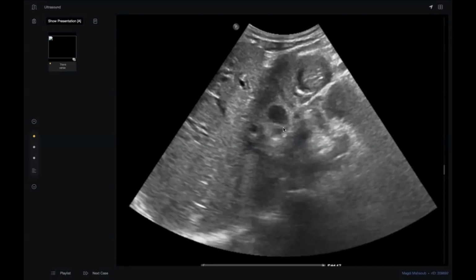I would like to see the pancreas on ultrasound in detail to rule out any mass in the uncinate process, head, or in the duodenum near the ampulla. Next, I can go for... I cannot appreciate any enlarged lymph nodes in the region.